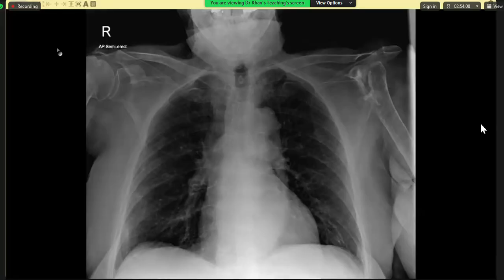There's also erosion seen at the lateral end of the clavicle on the same side. The bony density is generally reduced on the left side, most likely due to some diffuse atrophy. On the contralateral side, there is normally visualized humeral joint and humerus, clavicle and bones. Soft tissue, I cannot appreciate any asymmetry in any breast tissue.